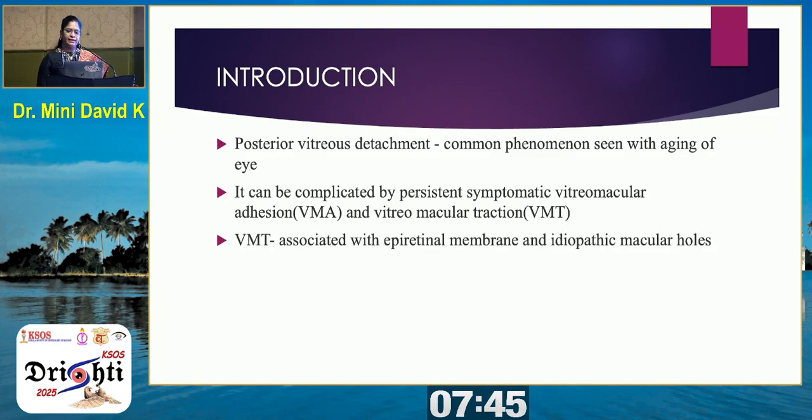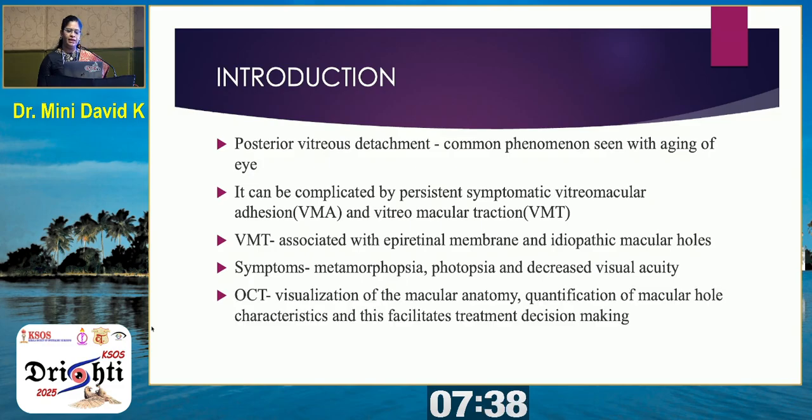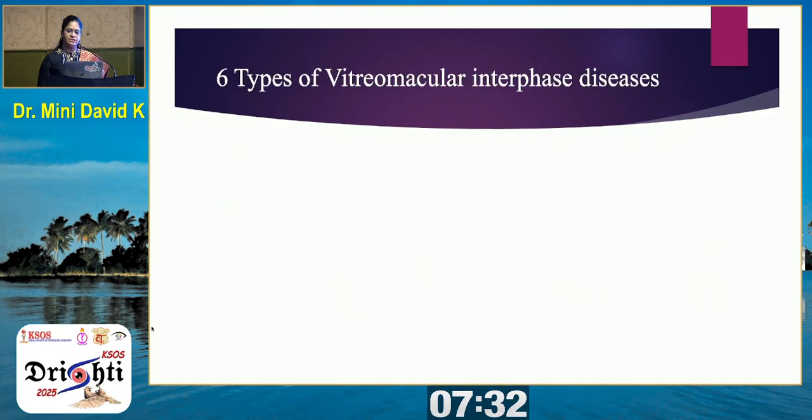VMT is associated with epiretinal membrane and idiopathic macular holes. Patients may present with metamorphopsia, photopsia, and decreased visual acuity. OCT is helpful in visualization of macular anatomy and quantification of macular hole characteristics, and this facilitates the treatment decision making.